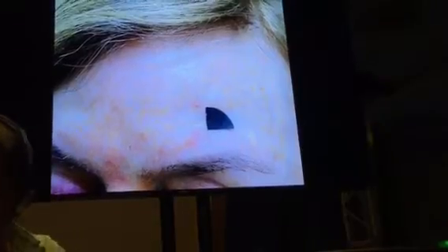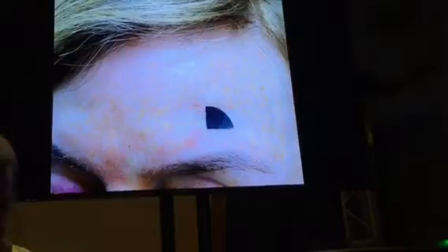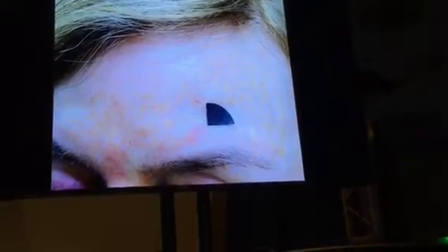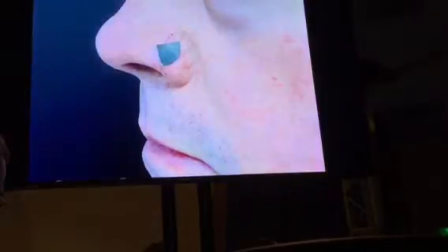And so I reiterate what was said earlier, that it's very useful to use dermoscopy, even on lesions that clinically you weren't so suspicious of. You might think that this is an actinic keratosis in this patient who has a lot of sun damage. But on dermoscopy, you can see a very clear example of arborizing vessels, allowing you to arrive at the diagnosis of micronodular basal cell carcinoma.